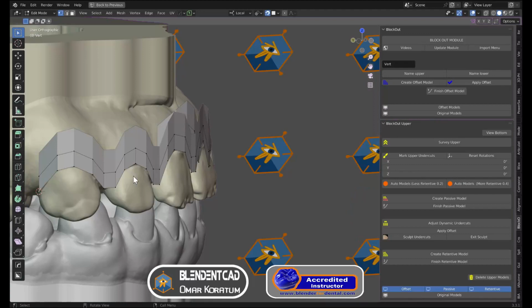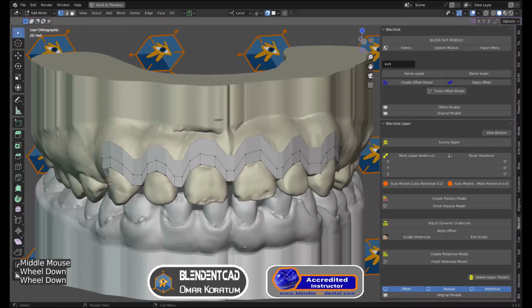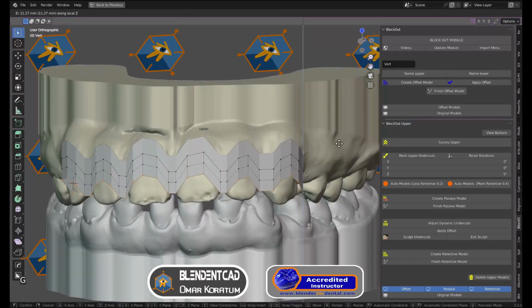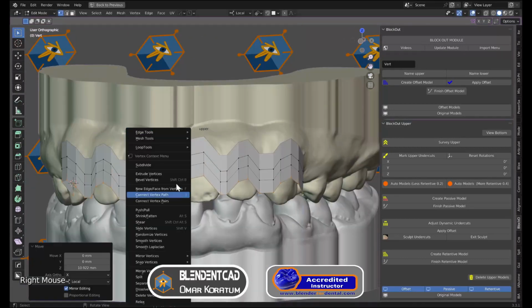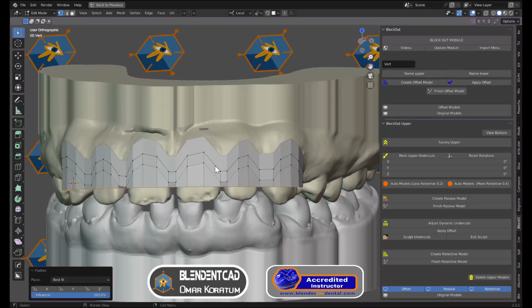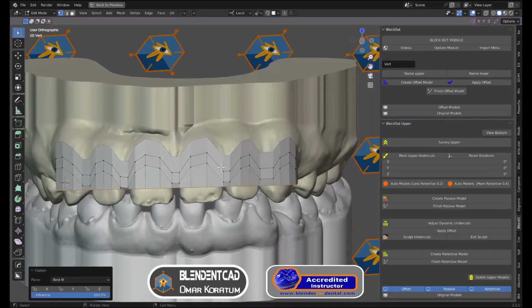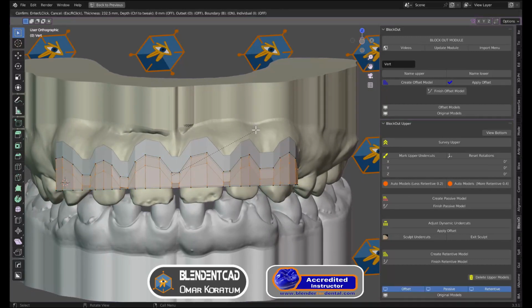To save some resin, I'm going to select the bottom vertices and then extrude them in Z-axis. Then I'm going to flatten all these vertices by using loop tools. And now we have created our cutter. Then we're going to select all vertices and do an inset of the faces. This decreases the distortion of the mesh when we are going to do the subdivision modifier.